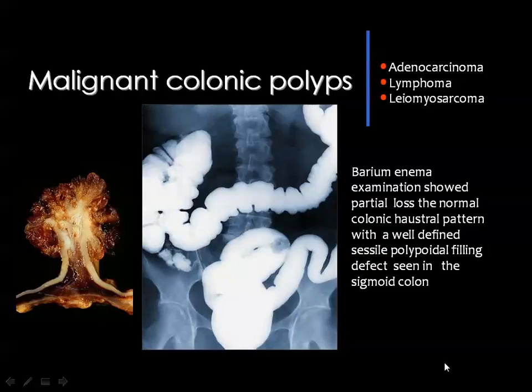Then we came to the malignant polyps or polypoid carcinoma of the colon, and this is usually a sessile lesion. You cannot see a pedicle.